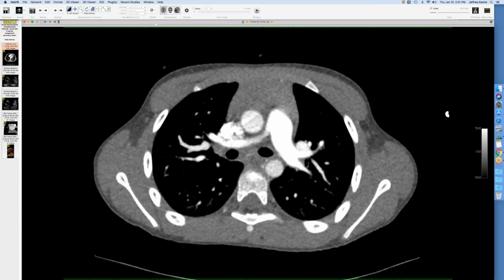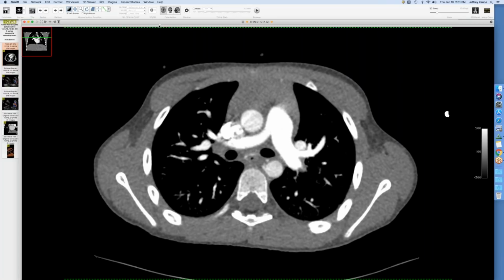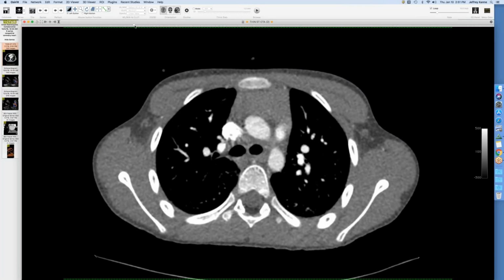Cool. So that might turn out to be interstitial edema rather than parenchymal amyloid after all, right? Oh, but it was there on multiple studies and hadn't changed. So, well, could be both. Yeah. All right. I'll show this quick.